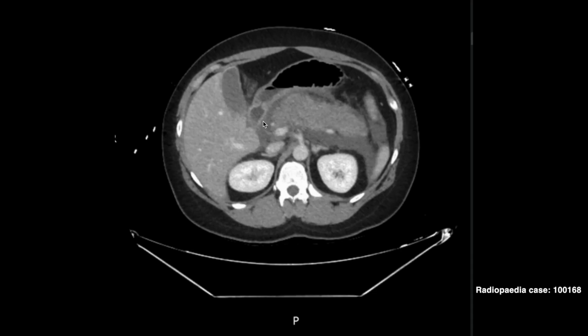CTSI, Balthazar C, 2 points. There is no necrosis, so 0 points. Total 2 points. And this is mild pancreatitis. This patient is going to be fine. Fluid, analgesics, monitor. But look at this case and lock in what the normal enhancement looks like. Because next we are going to show you what happens when it's not there.